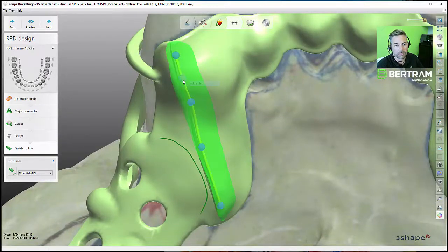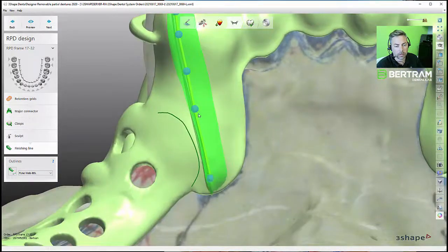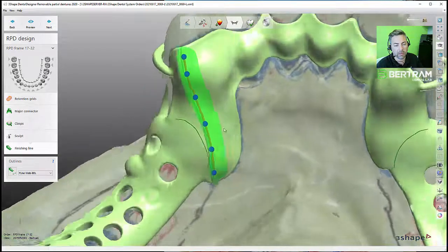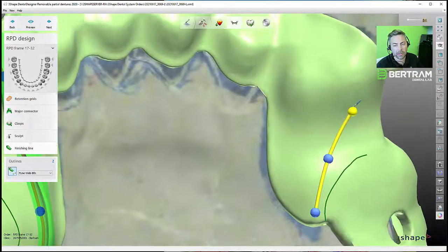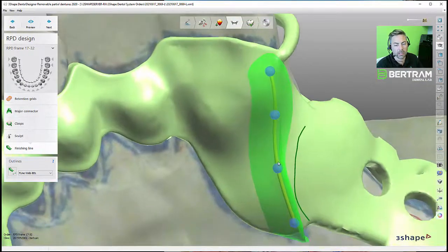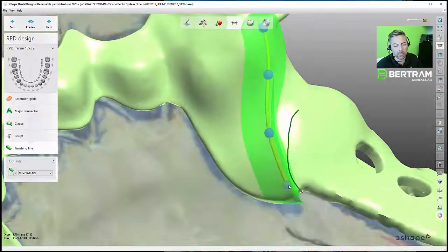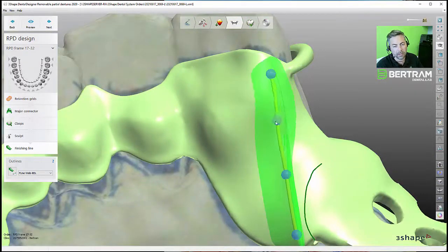Keep this back a little bit more here. Now, some people like to get very, I'll say, scrolly with their finishing lines. Historically, we've always had them pretty straight. We will downturn, like an upper at the end of a saddle, those sometimes just based on the shape. This one I'm going to give a little bit of a curve to just at the bottom. I'm kind of following this line here, and then I'm following here, but you could do it straight as well. It'd be fine.